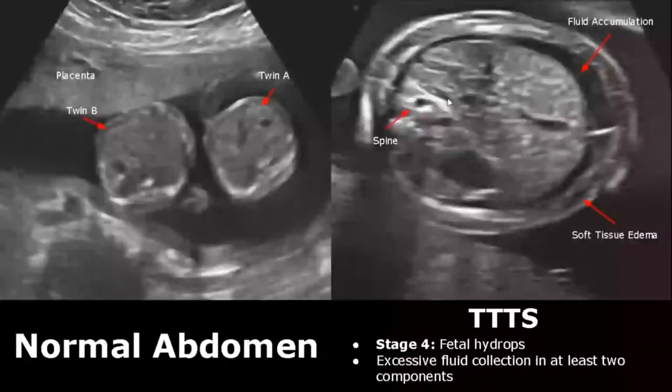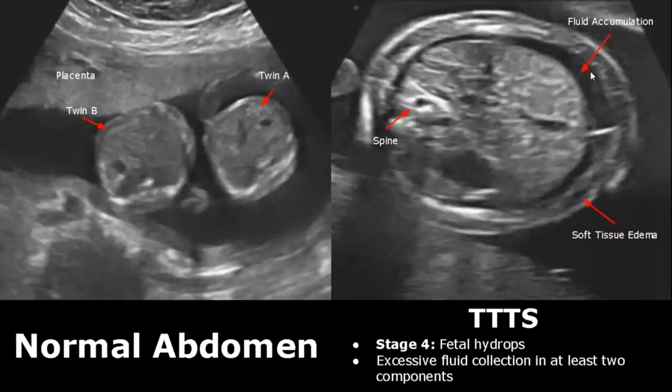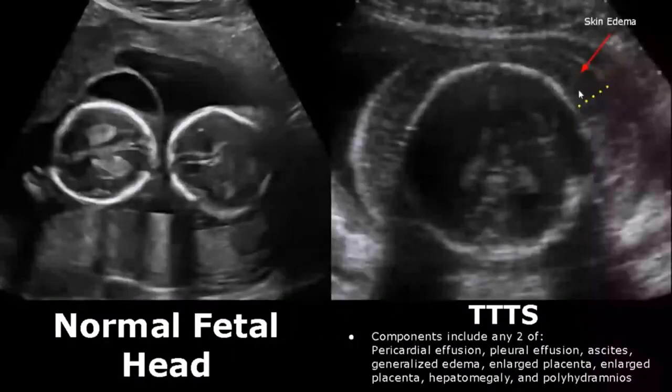Fetal hydrops is in the fourth stage of twin-to-twin transfusion syndrome. Excessive fluid collection will be found in at least two components. Here we see ascites and soft tissue edema. It usually occurs in the recipient twin. These components include pericardial effusion, pleural effusion, ascites, generalized edema, enlarged placenta, hepatomegaly, and polyhydramnios.